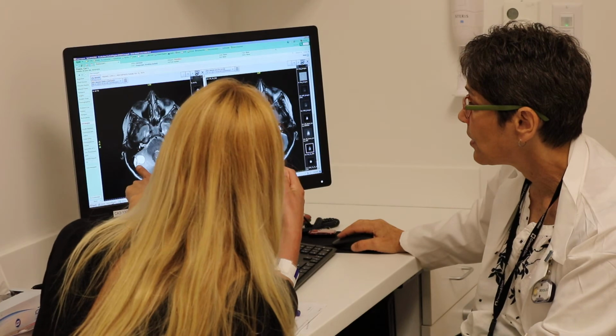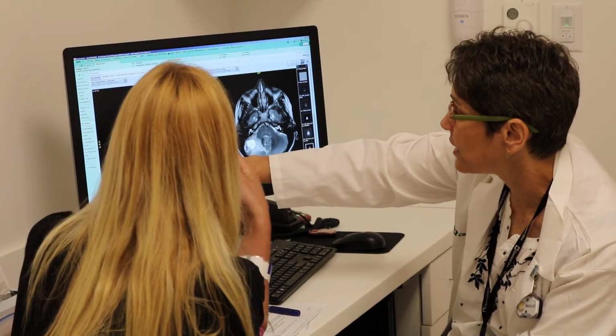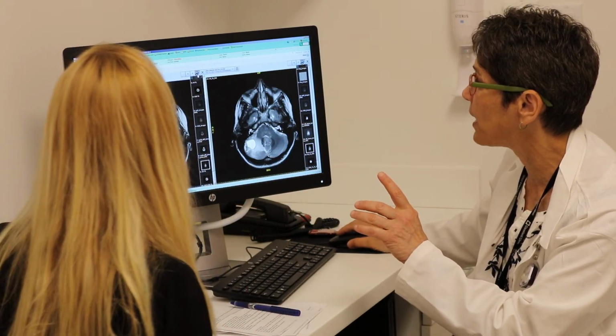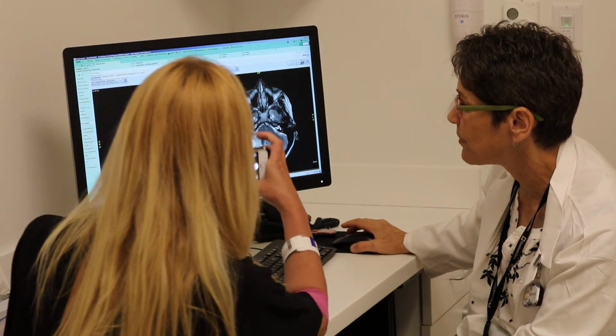I do see a change though. So this one is December and this was today on the right? This is December, yeah, and that's today. Oh, wait a minute. I want to get rid of these little ones, because you'll get a better view.